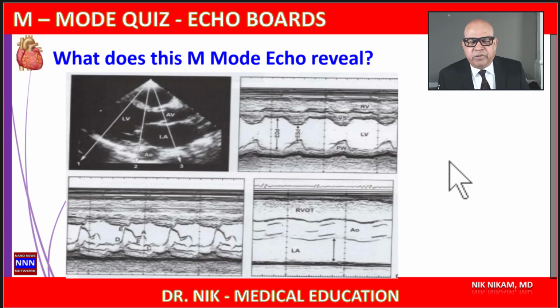This whole presentation is going to be sort of interactive because this is a setup in a question-answer style. So I'm going to be pausing after each new image. You will have time to write down your findings. I'm not going to give you multiple choice questions because I want you to independently think and identify the normal or abnormal finding that you see in these tracings. Then we're going to come up with a discussion and add some more background information so that we have a more solid understanding of M-mode echocardiography in the context of 2D, 3D and TEE studies.